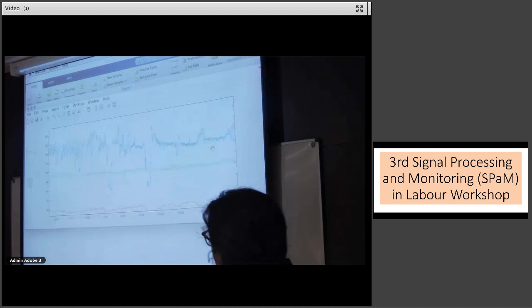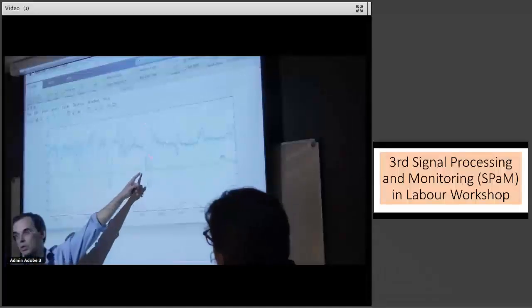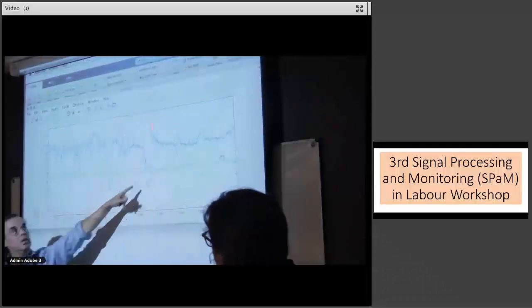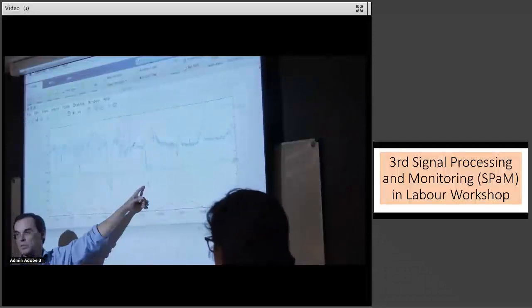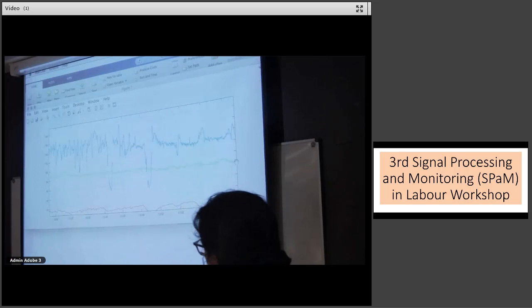These are very typical of compression, aren't they? With the shouldering. So if you get a lot of these, maybe you start getting worried, or some people get worried and start thinking of amnio infusion. But these are really not very long. Okay, we should continue, please.